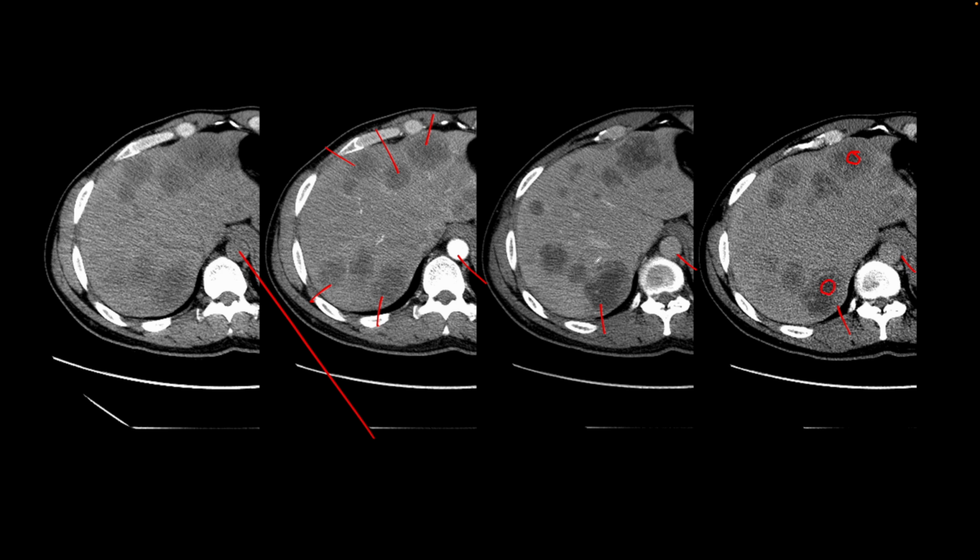So when there are multiple lesions of variable sizes in both lobes of the liver, the diagnosis most of the times is metastatic disease. Mets to the liver from most malignancies are hypodense like this on multiphasic study. Some tumors lead to hyperenhancing or hypervascular metastases. These include renal cell carcinoma, thyroid cancer, melanomas, and neuroendocrine tumors. This patient had a history of colon cancer, and these are Mets from a colon primary.